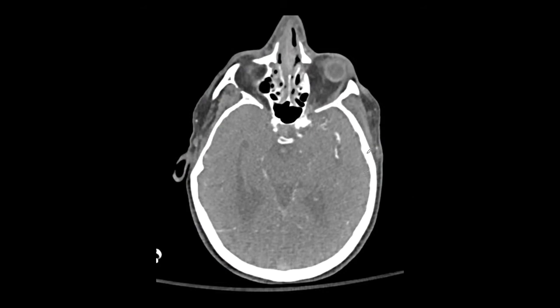Right, I can see why you would say that, because here you can see that and here you do not. But the head is tilted, and this is kind of in the MCA distribution, meaning the Sylvian fissure, whereas here the head is a little tilted, so I don't see the Sylvian fissure. I can see why you're thinking what you're thinking. That's great. But maybe the head is tilted, so I don't see that one. Is there anything else?